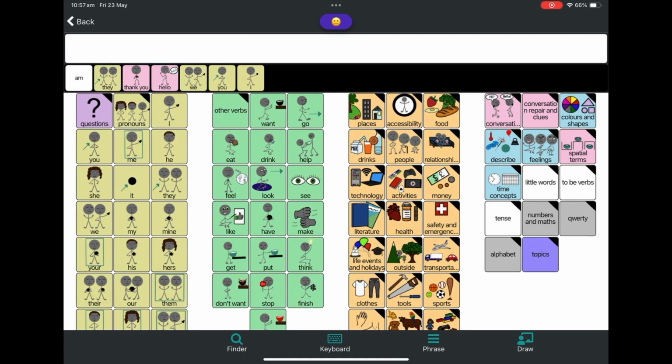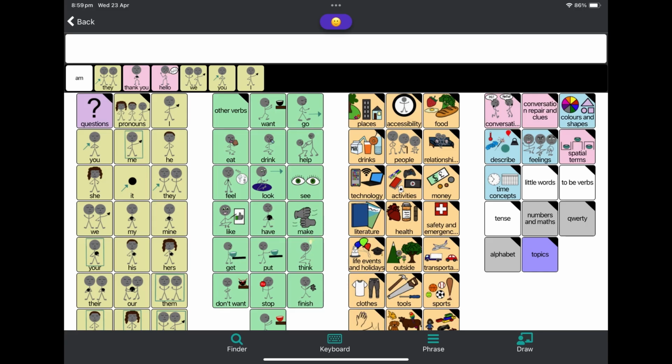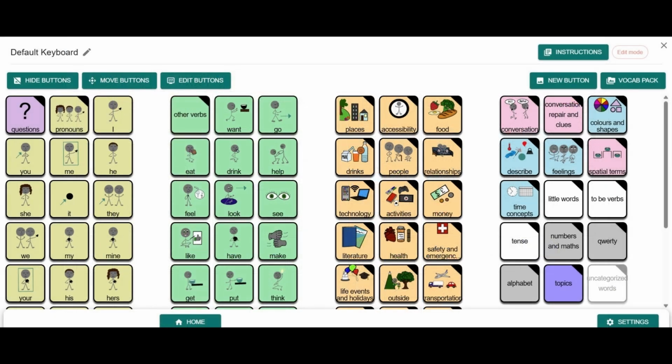You can lock editing to prevent accidental settings changes. Customizations are automatically backed up onto your Weave account. Weave Chat allows remote editing via the Weave Chat Connect website.